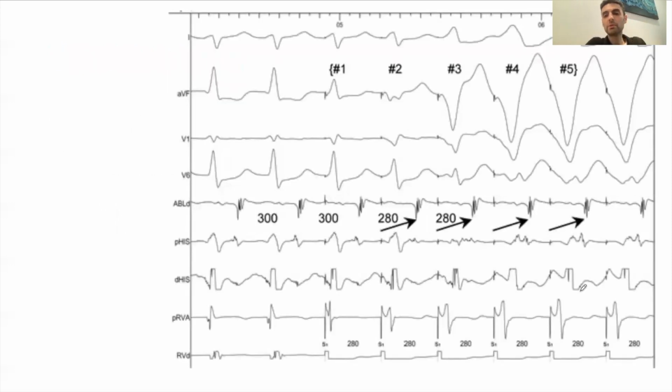So let's just show one example here. This is a patient who's having a regular narrow complex tachycardia, longish RP, these are your A's, okay, regular, and then you are V pacing, okay, earliest A is at the His. So you V pace, this is your first V pace stimulus. You note that the QRS has changed, hence you captured the V, and in this case, the QRS is not very wide. Then you definitely fused with the native tachycardia QRS, and hence this was a His refractory ventricular stimulus.